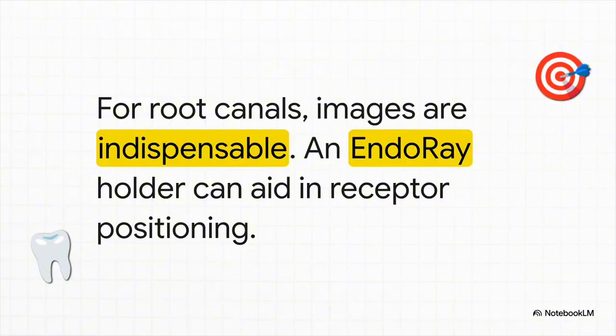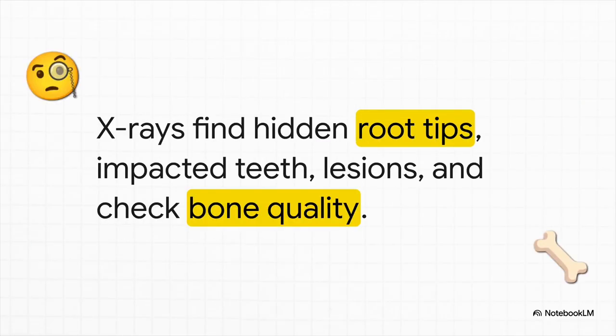And what about during a root canal? Well, X-rays are absolutely essential, but with all the dental dams and instruments in the way, it gets really tricky. That's where these cool specialized tools like the EndoRay holder come into play. It's designed specifically to fit around all that equipment and get the sensor in the perfect spot for those supercritical images.